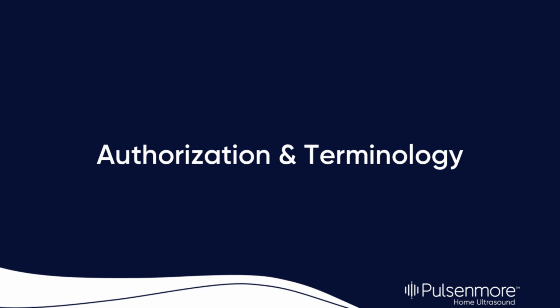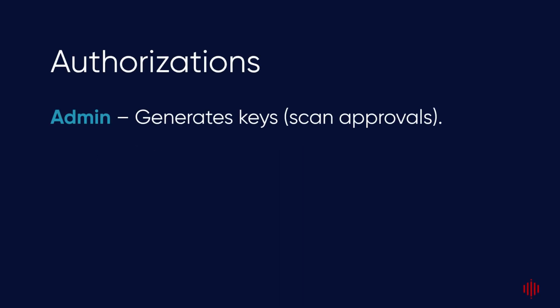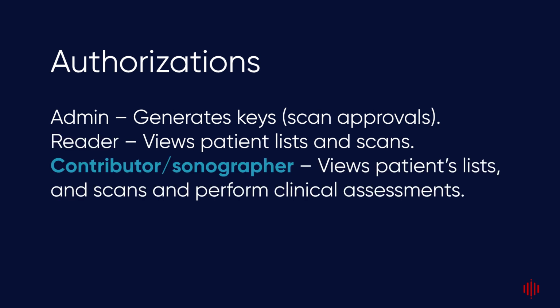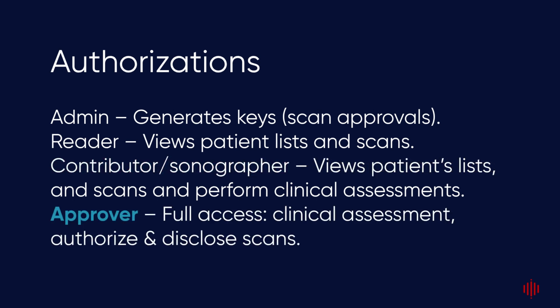It's important to allocate the correct roles to the different people on your team. The admin can edit technical aspects and generate scan approvals. A reader can view patient lists and scans. A contributor can view patient lists and scans and perform clinical assessments. The approver has full access to assess, authorize, and disclose scan results.